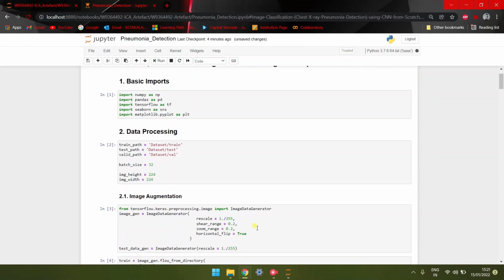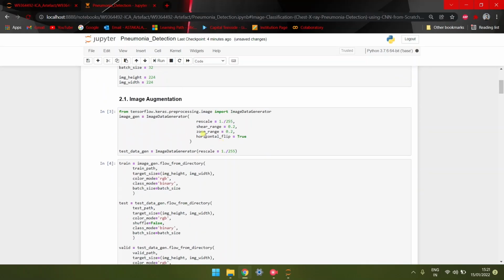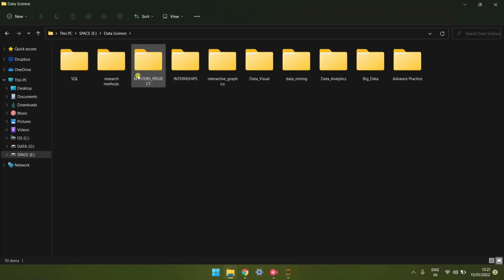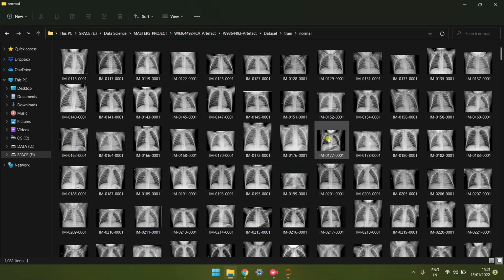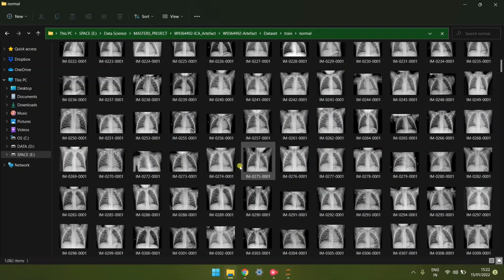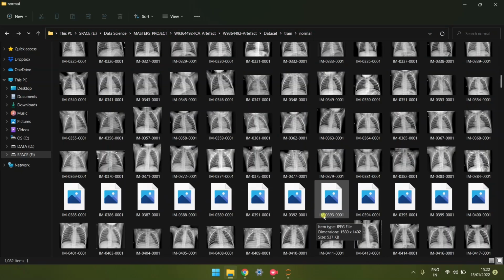Once the data is loaded, the next major task is that all the images need to be augmented, a process called image augmentation. If we observe the raw X-ray images in the raw data set, you can clearly see that the images are not the same shape or size, and some are tilted to the left side, some to the right side.